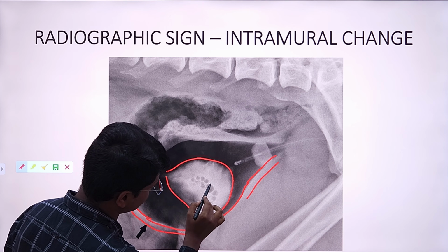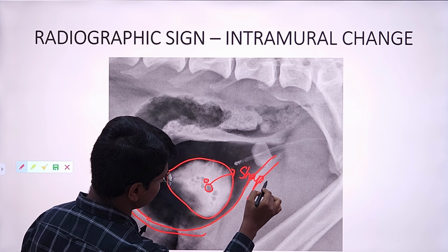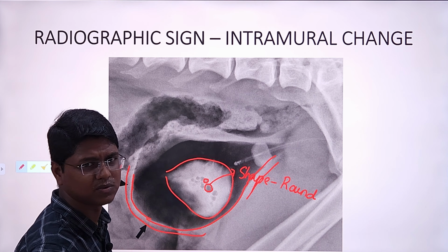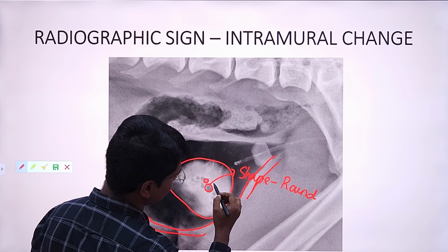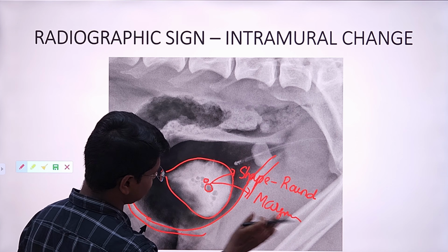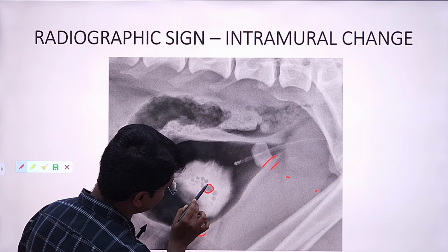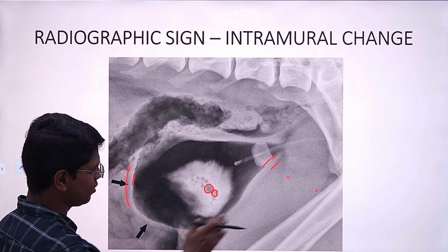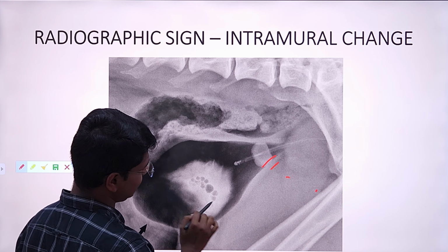See here, the shape may sometimes be round, like oxalate stones, urate. They are kind of circular, and the margins are indistinct but regular. You can see some margins, but usually they are indistinct. But you can see the margins; they are comparatively nicely visualized. So these are basically calculi.